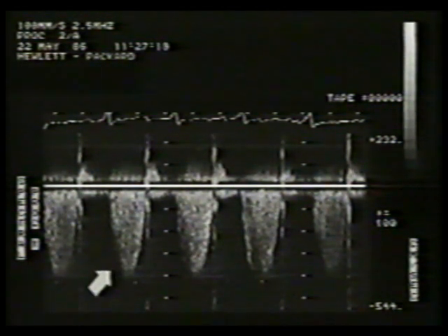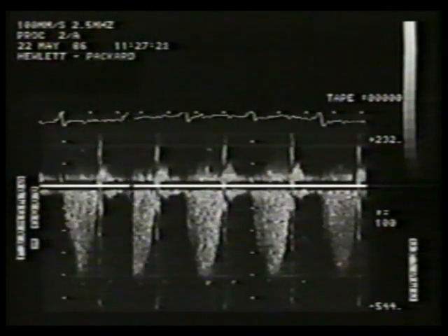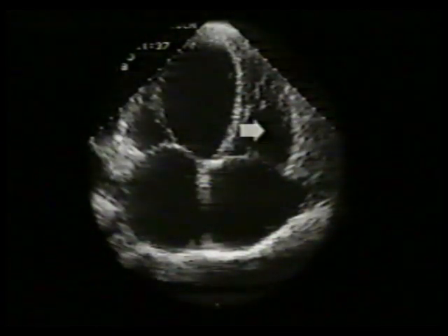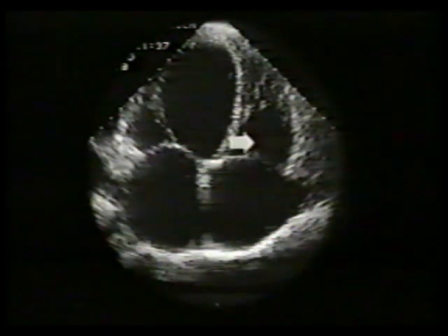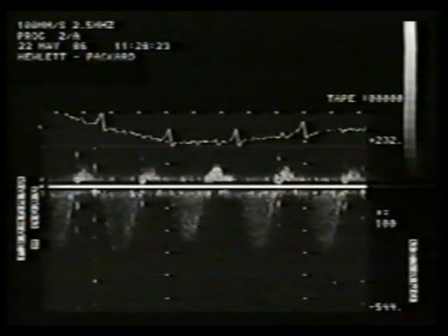Furthermore, note this gradual rate of increase of the MR velocity, which indicates LV dysfunction with decreased rate of pressure generation. One would now want to determine if the right-sided enlargement and RV dysfunction are due to pulmonary hypertension, secondary to his left-sided findings, or if the RV is simply involved with the myopathic process.